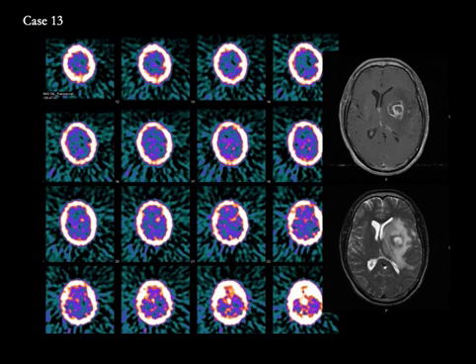Another infrequently performed brain SPECT. This is a patient who is HIV positive, and on the right we have transaxial images showing a ring enhancing lesion with significant mass effect on the left in the subcortical white matter. In an HIV positive patient, frequently the question is toxoplasmosis versus lymphoma, and the nuclear medicine study we do for this purpose is thallium 201 chloride brain SPECT.